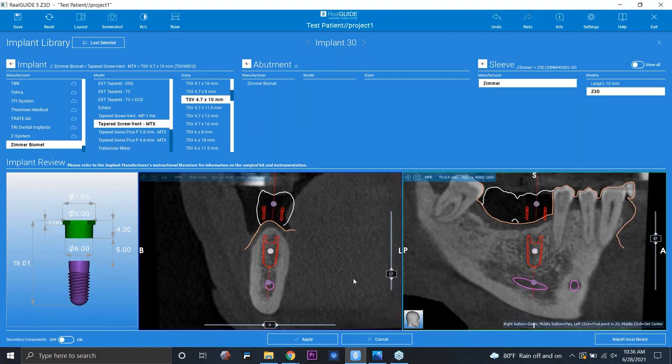The other thing you'll notice is that it gave me that anatomy collision warning, and it turned my implant red. So what the software is recognizing, it's saying, hey, this orange outline is your model. Your sleeve is actually crossing over into the model. It's basically telling us that it's impinging onto the anatomy. So in this particular scenario, while that collision is not going to stop me from any planning or designing, it is alerting me that there's a couple of surgical considerations to take into account.